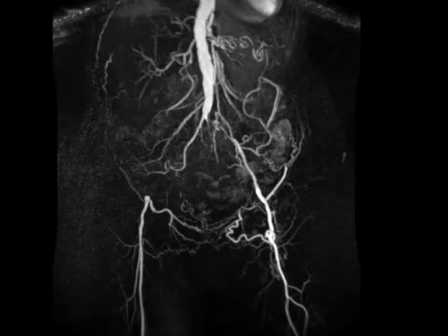But they had known about this about 20 years ago. They placed a left-sided iliac stent, and there was collateralization to the contralateral right side. So the right lower extremity is getting arterial supply through the collateral vessels.